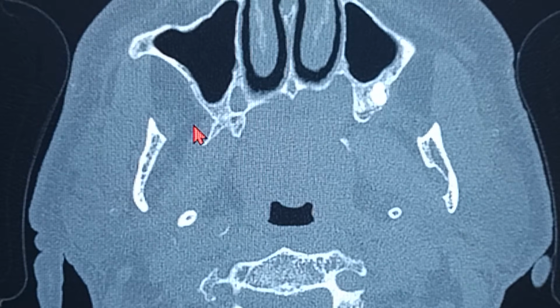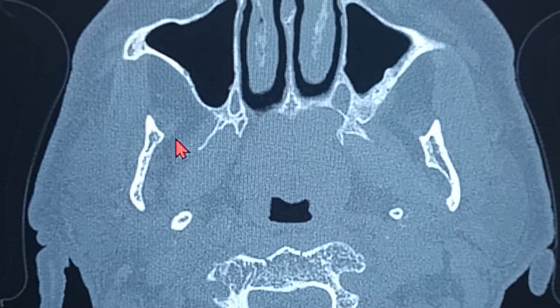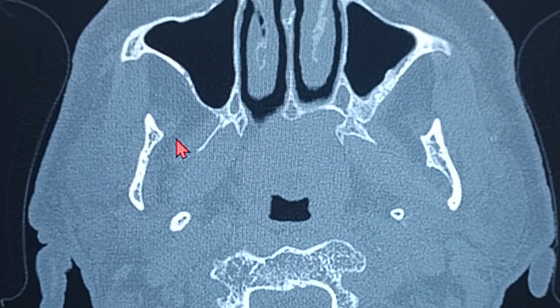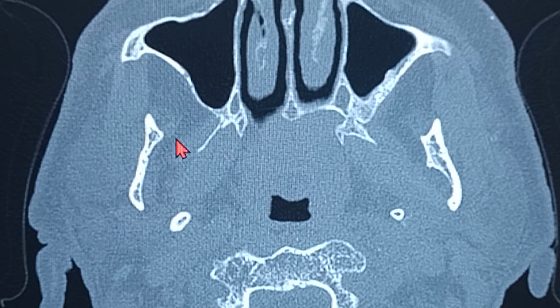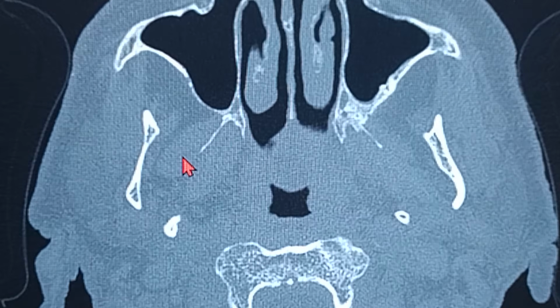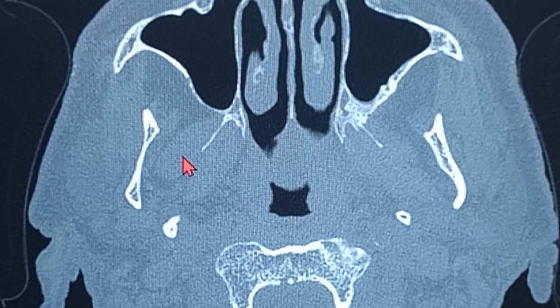That's the ideal thickness, and you should ask for it in all three views, that is the sagittal, axial and the coronal view. The best views are basically the axial and then the coronal. Okay, so first I'm going to be talking about the basic anatomy from below above.